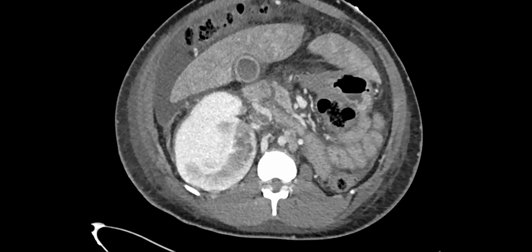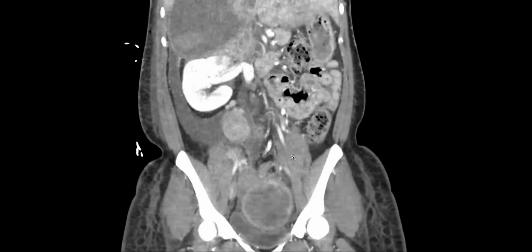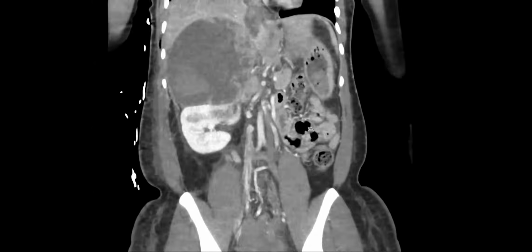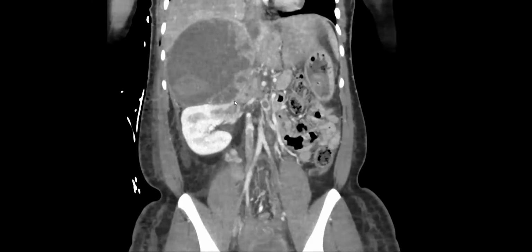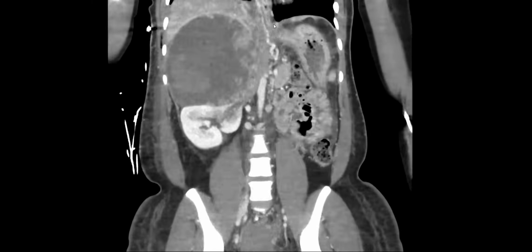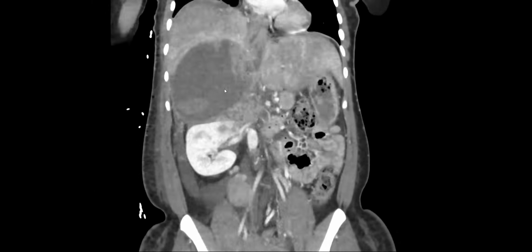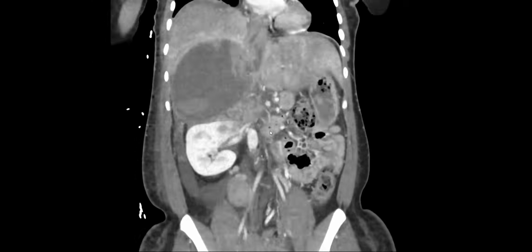Sorry, hold on, I'm not sure which study I'm showing right now. But the question you were thinking about was, is it renal or adrenal? Adrenal. So we have one vote for adrenal. The kidney seems pushed, and it's not the claw sign. So this was adrenal. What do you think it is? ACC. Yes, exactly. This was adrenocortical carcinoma growing up the IVC to the heart. There were already lung mets.